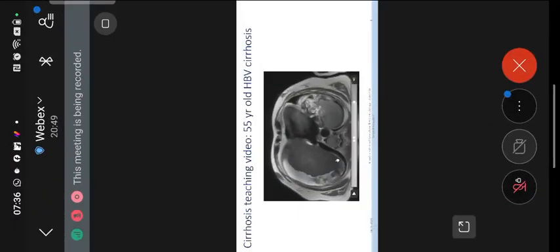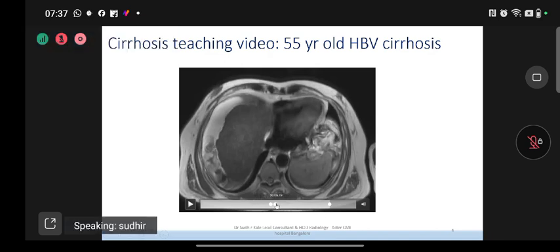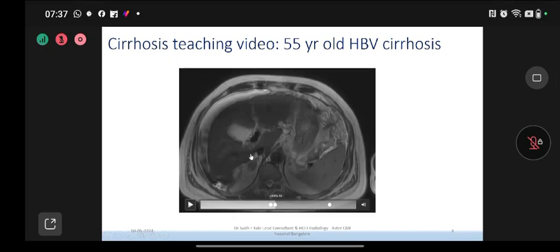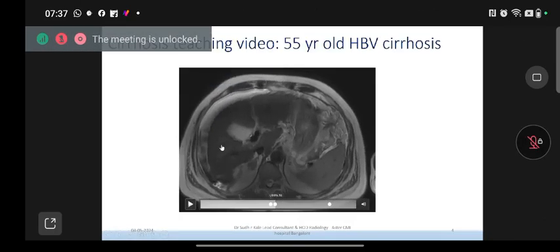So here there is an ascites, and also look at the surface of the liver. The surface of the liver is generally very smooth. You can see here now there is a nodular liver. So this is one of the pointers again to tell that we are dealing with a diseased liver. Then there are a few other things, like there is a volume redistribution of the liver. You can see there is a caudate lobe hypertrophy, there is an atrophy of the right lobe, and also prominent interlobar fissures. All of these you can see are nicely seen in patients with CLD, right?